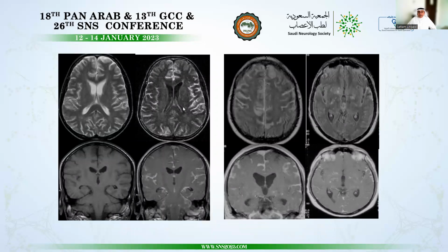With meningitis, you see high signal intensity of the sulci. The CSF within the sulci is very proteinaceous, reflecting high signal intensity. The other differential diagnosis for high signal intensity sulci on FLAIR is subarachnoid hemorrhage, because both will result in proteinaceous CSF.